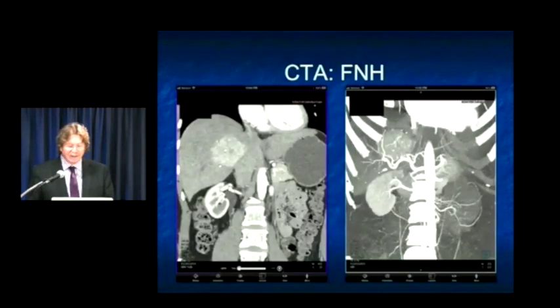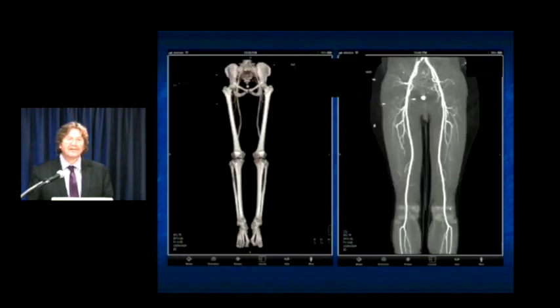When you look at the reconstructions, and here's just an example, this is reconstructions off an iPad, okay? So you're using a $600 device for displaying reconstructions, which means that 3D is no longer just in the lab, but it's anywhere we are, whether it's on an iPhone, whether it's on an iPad, and perhaps soon on your iWatch, though I think the iWatch may not be the place you're going to see this information.